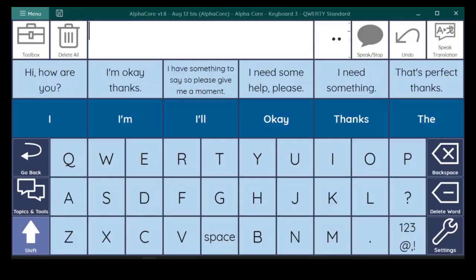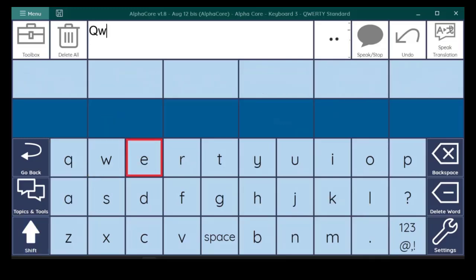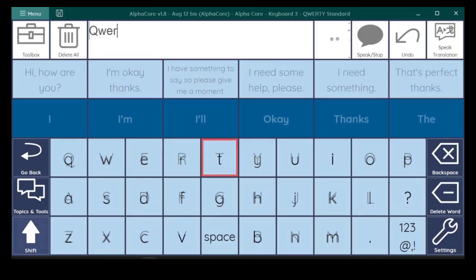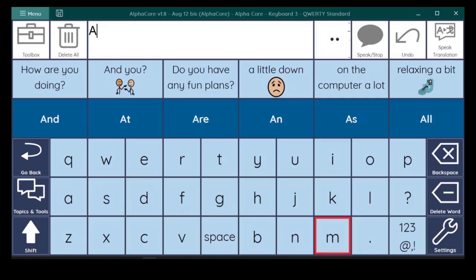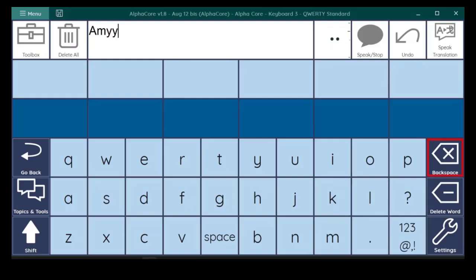Step 7. Practice eye tracking. Once you select your keyboard and selection method, try the following to practice and determine if you have the best combination. On your keyboard, start with the letter Q and type each letter once from left to right in each row until you reach the M. If that was successful, try to type your full name. If you are struggling, you may need a keyboard with larger buttons or an adjustment to the dwell timing.